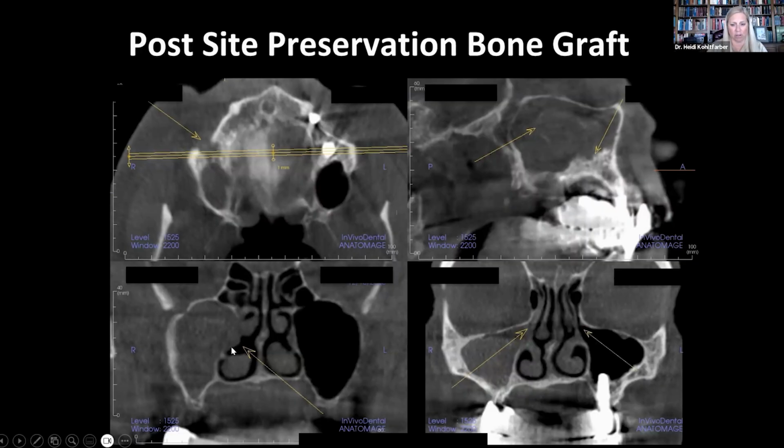And this is called a mucocele. If the sinus drainage pathway becomes blocked, the sinus can start to act like a pathological cavity and start to extend. And that, in fact, is what we see here. So now we have a chronic inflammatory process. We have a mucocele that is iatrogenic in origin, and this patient needs to go to ENT.